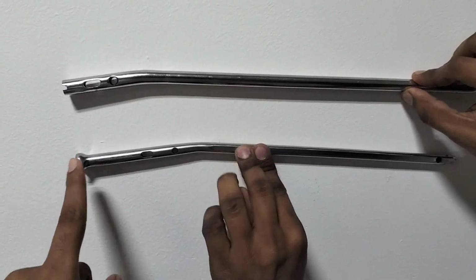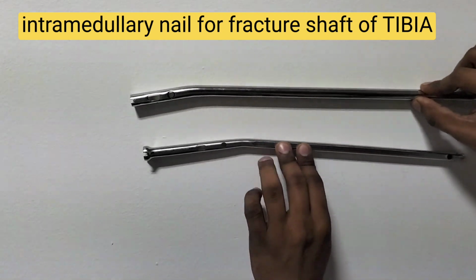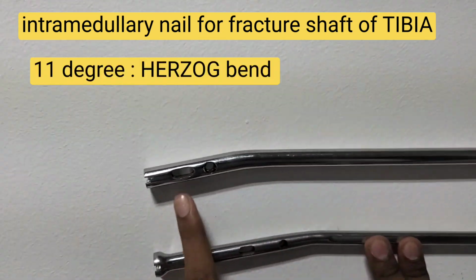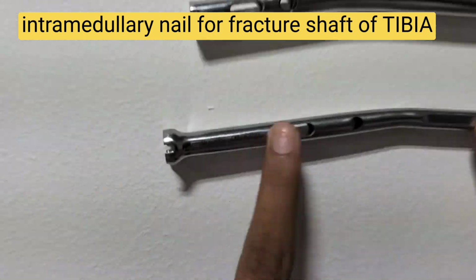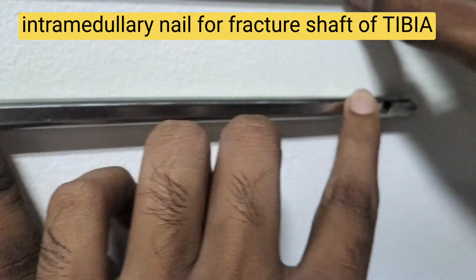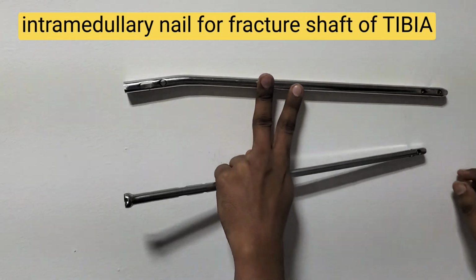You can see these are the intramedullary nails for fracture of the shaft of the tibia. How can I tell this is a tibial intramedullary nail? You can see there is some bend here, some 11-degree bend. This is known as Herzog's bend. And here you can see the holes are like this. This is dynamic one, and this is static, and opposite and all are static. This is an intramedullary nail for shaft of tibial fracture.